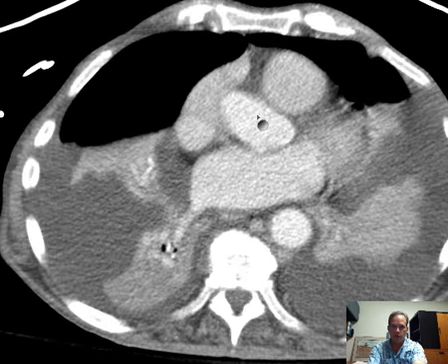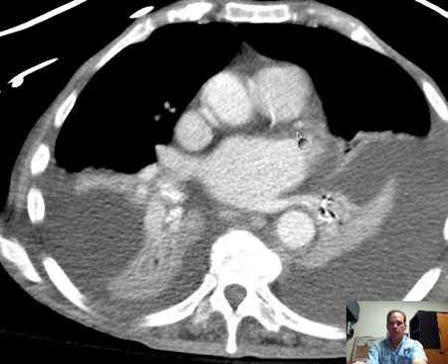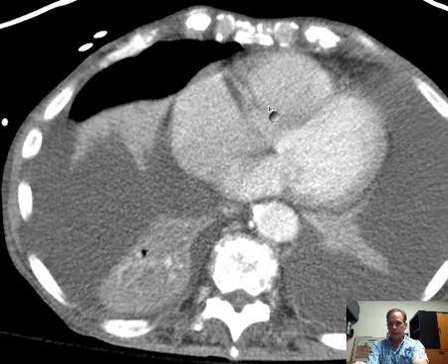So the aorta and the atrium are kind of forming an angle with the ventricle. So instead of what you might expect, which would be blood comes into the left ventricle, the ventricle contracts and goes out the aorta, the blood comes from the left atrium into the left ventricle, and then when the left ventricle contracts, it shoots it back almost the same way that it came from. So that is the aorta, and if you back up, you'll see it's coming from the left ventricle.